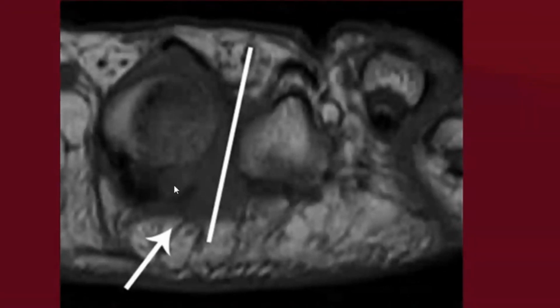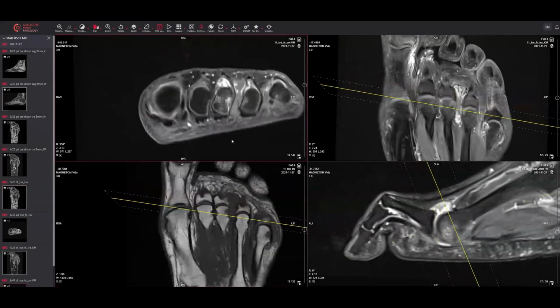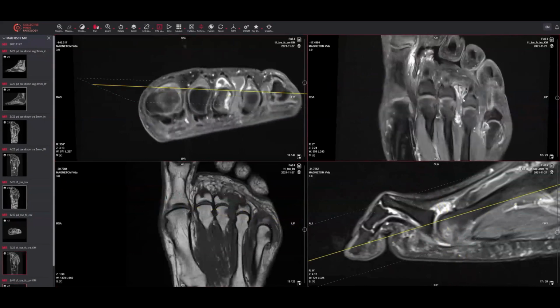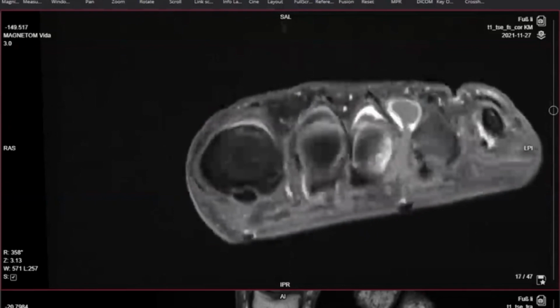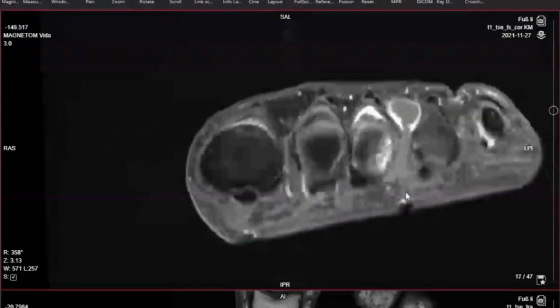By terming it out as a pseudoneuroma, we're more likely to alert the clinician that what we need to treat here is a plantar plate tear. Case we're assessing this large M3, M4 interdigital lesion, all the features of this enlarged interdigital nerve. And we're now assessing again the difference between a neuroma and the non-neuromatous lesions. Those non-neuromatous lesions would be seen in association with the plantar plate tear. And like some Morton's neuromas, it may have intermediate signal intensity on T1 and T2 weighted images.